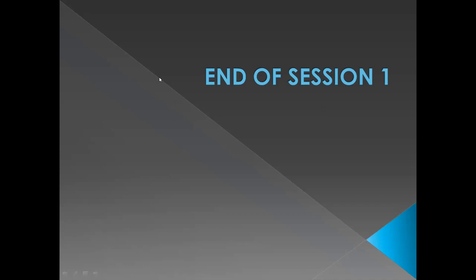And most of the time, X-rays are not clear, we just get a rough image. Yes, that is very true, and that is the reason I mentioned this report, in which it has mentioned that technical skill and experience are very important. Plus, the book images that you are seeing are all digital X-rays, but most of the time those X-rays are not digital; they come out on the conventional film, which is again not very clear. So that is the reason why we have trouble interpreting those X-rays.